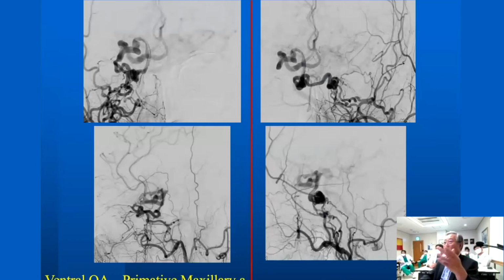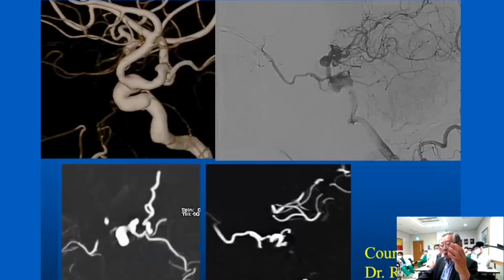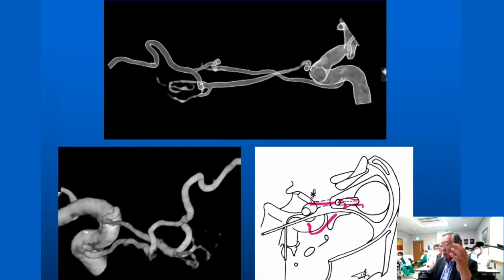This is another complex case. It takes a long time to explain it. One other case I want to show you. I'm showing you all the jewels. Look at this. What do you have?